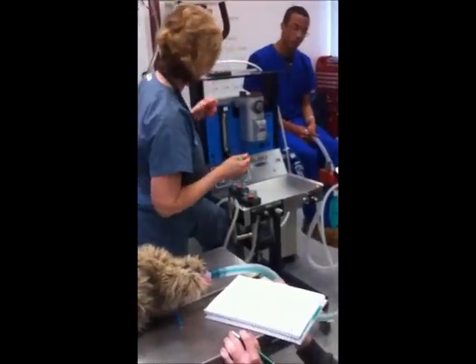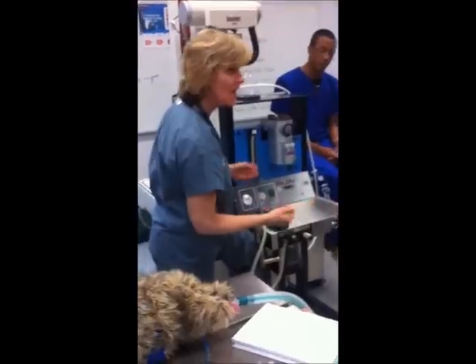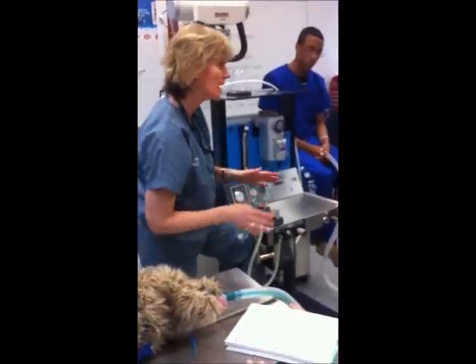Some students are fine just showing all four in the order of flow through the machine. Others just want to show me where stuff is, and then they'll lay the cards out in terms of this is where the gas hits first, second, third, fourth. Either way, I'm fine with that.